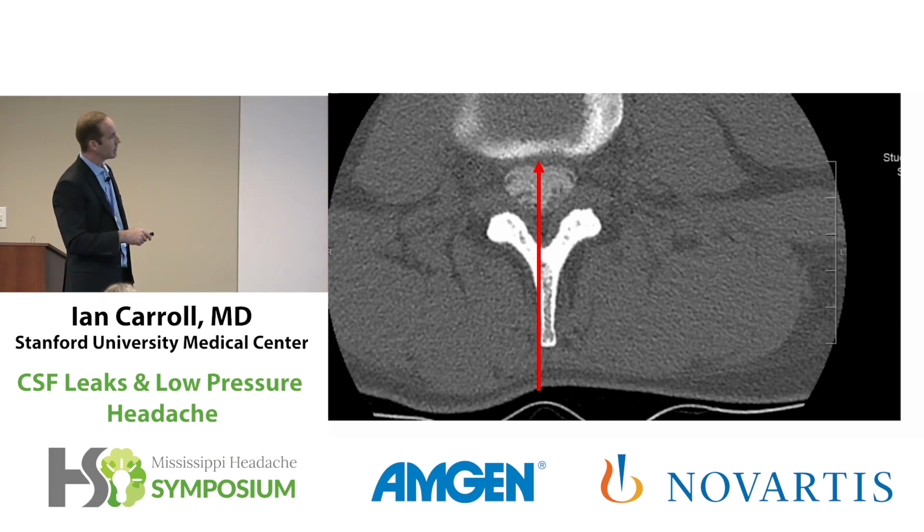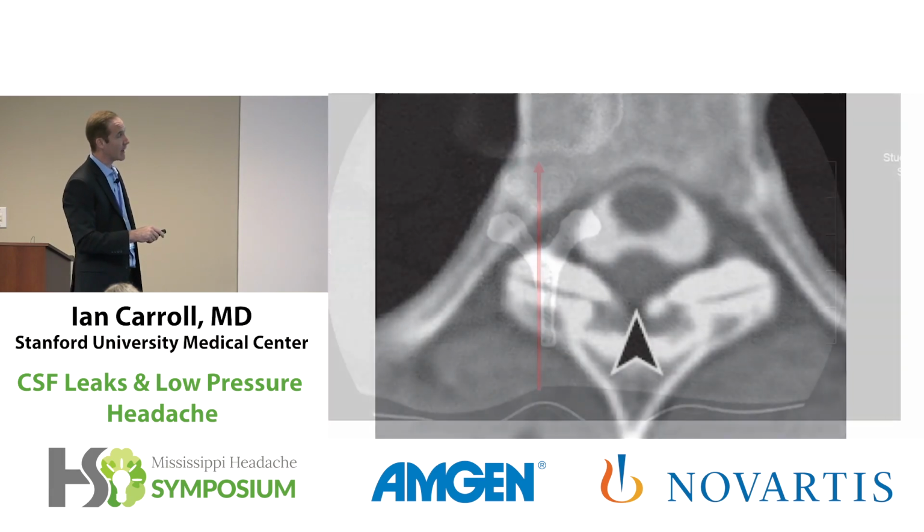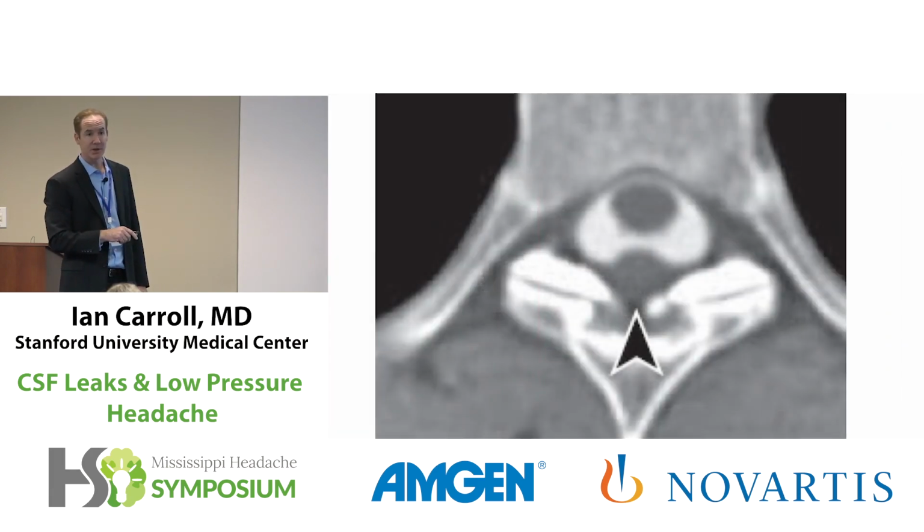Well, that could be a problem. This is what it looks like on a myelogram after an epidural blood patch. So this person has spread on both sides of midline, but notice it's just pushing the back surface of the bag of fluid in. None of the blood injected in this patch is getting to the front surface at all.